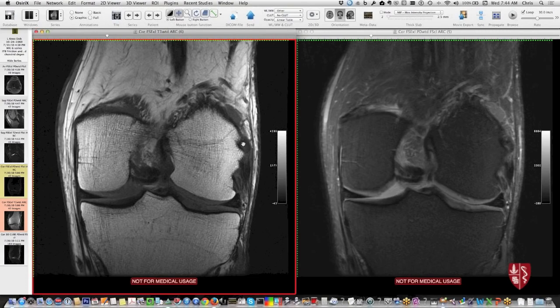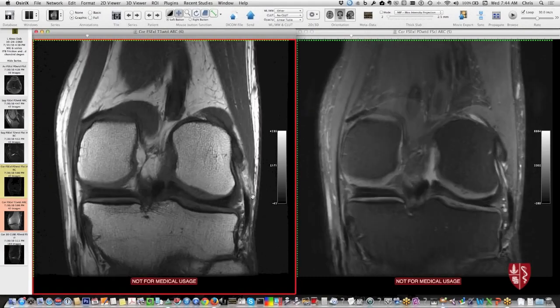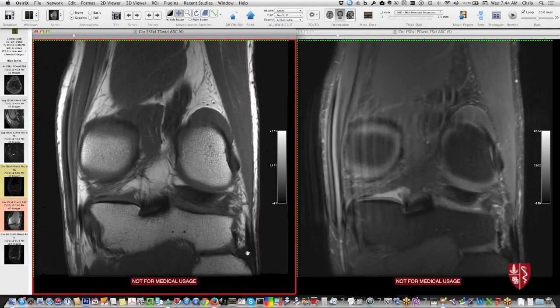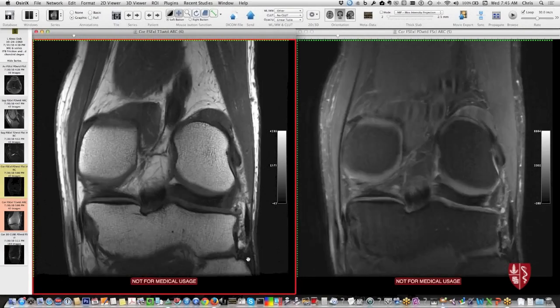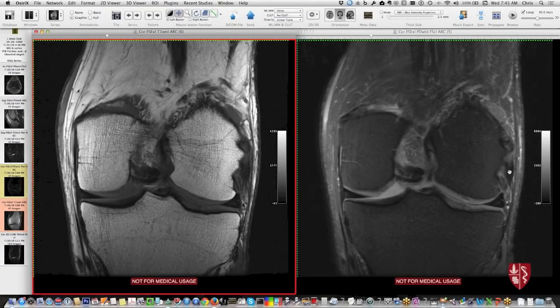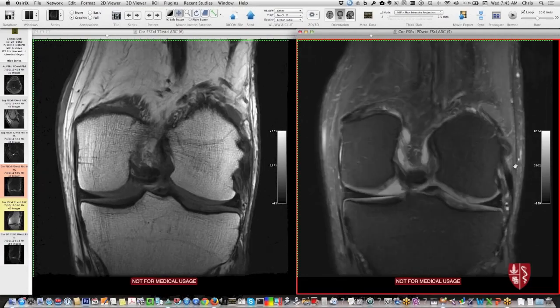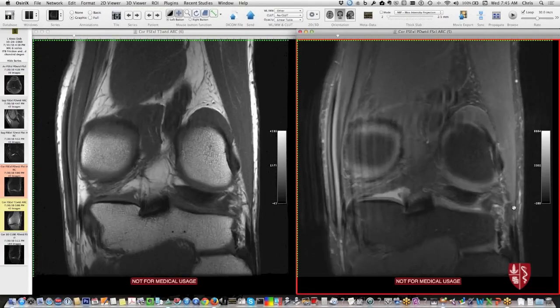So this tissue right there, that's part of the fibular collateral ligament, and then that's going to go down obliquely, and I have to scroll posteriorly to find that fibular collateral right in here where the hand is, going down to the fibula here. So again, I have to go find it on the T1s, and then on the PD over here, you can find a little bit of signal, but this ligament is pretty easy to identify if you know where to look.